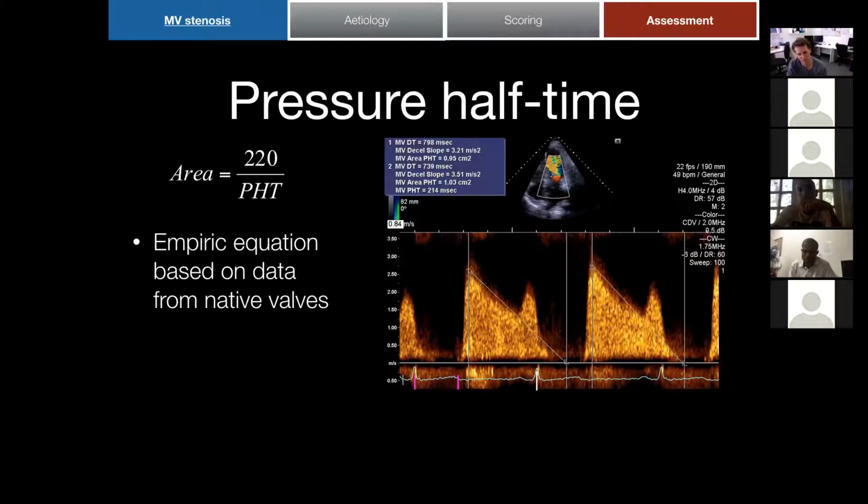I think we've got one slope that's there and then one slope that's there. Can I persuade you of that? It might not be the best example. It's that slope that we should be using. So was your argument that I should make it steeper or flatter? Make it more severe, flatter. Yeah, sorry, I misunderstood. Absolutely right. So if you do have a sharp one there and a flat one there, you go the mid-diastolic slope. So nice.